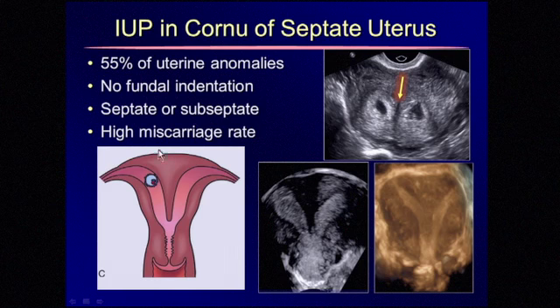So once we have that, we then look inside the uterus, and it can have a septum, which comes partially or completely down, the complete septate or subseptate uterus. Now, here on the 3D, you see the smooth fundal contour, and you see a division. You see this angled, pointed segment that's the septum that can come way down. And on ultrasound, on a cross-sectional image, we see a shadow.